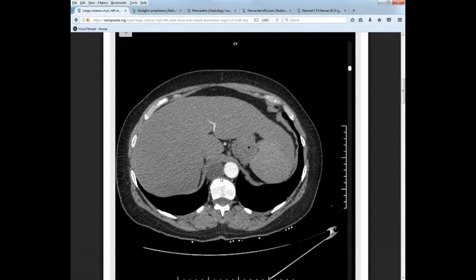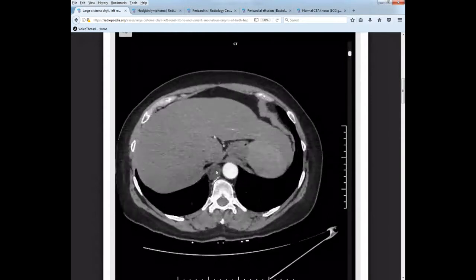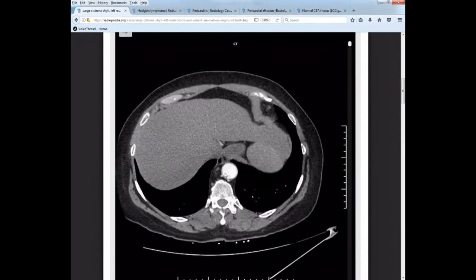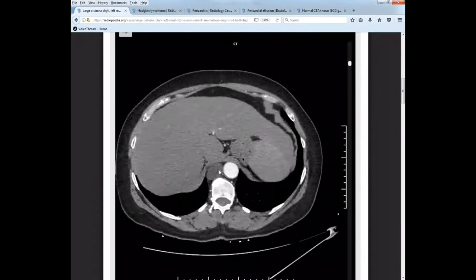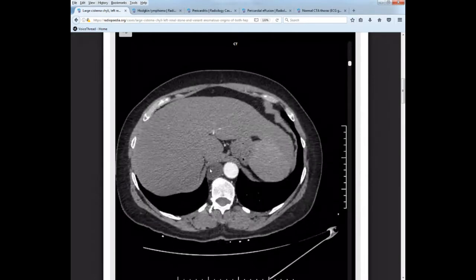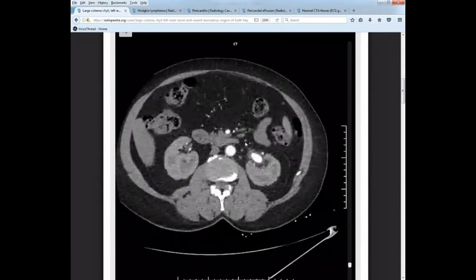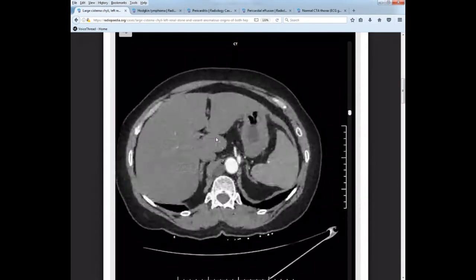Most patients, you're not going to see this. You might be able to make out the fleck of the thoracic duct, but again, it's going to be very difficult to see. So on this patient, I did want to just point out the large cisterna chyli, and if you just look in the area of T12 to L1, that's about where it is. If you do see something that is kind of grayed just to the right of the descending aorta, that's your cisterna chyli. Okay. Moving on, let's go to the heart.